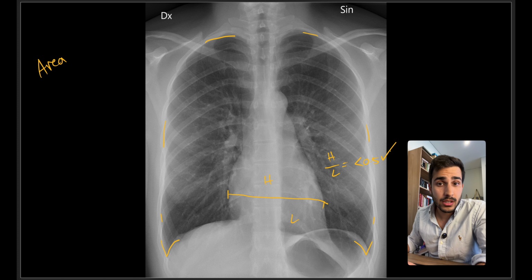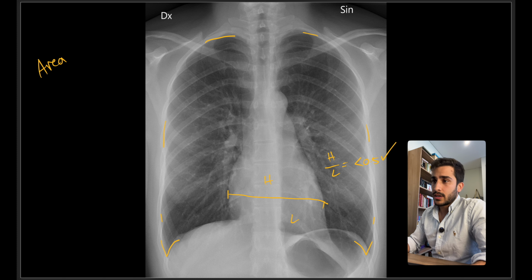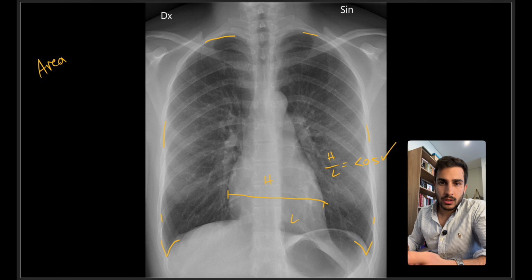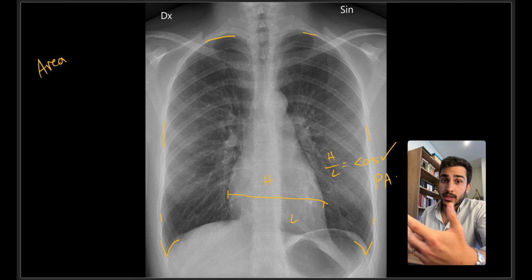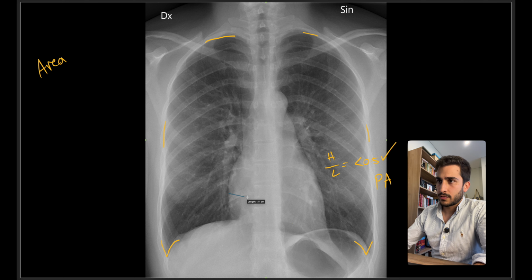Okay, if it's less than 0.5, then they have an adequate or ideal cardiothoracic ratio. And this is assuming, by the way, you do the X-ray in the PA position, not the AP position, as that causes magnification. Okay, so for example, if I take the measurement here, so that is 6.7 centimeters, let's say, and the other one is, let me draw another one here.